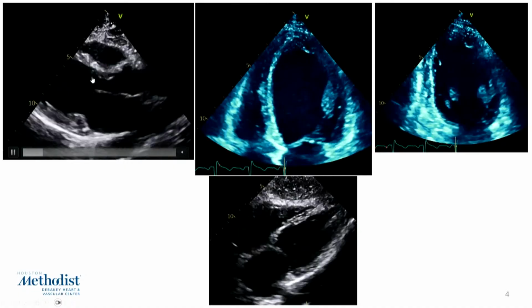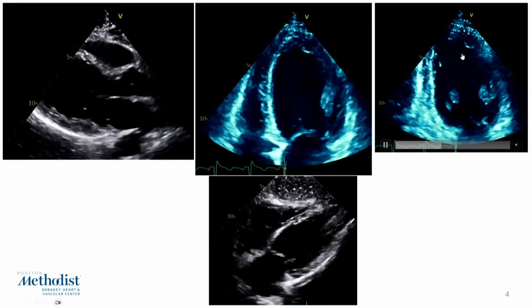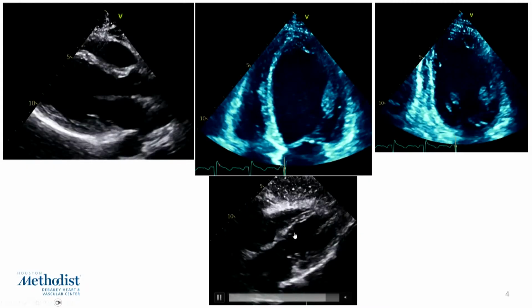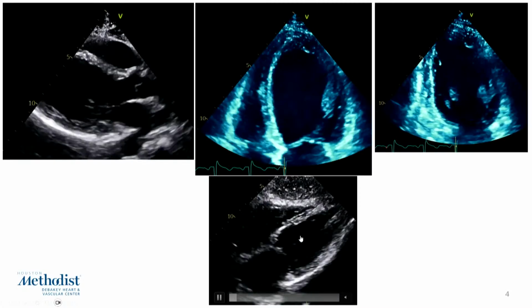It looks like the middle of the ventricle isn't contracting really well, but the apex otherwise is doing decently, at least on these views. You can see it pretty well in the subcostal view, where the apex seems to be working well, but the mid-ventricle isn't working that well.